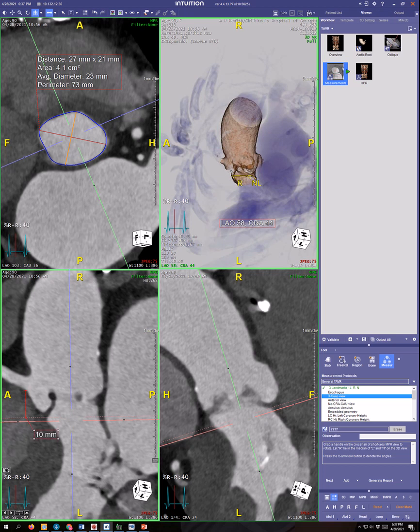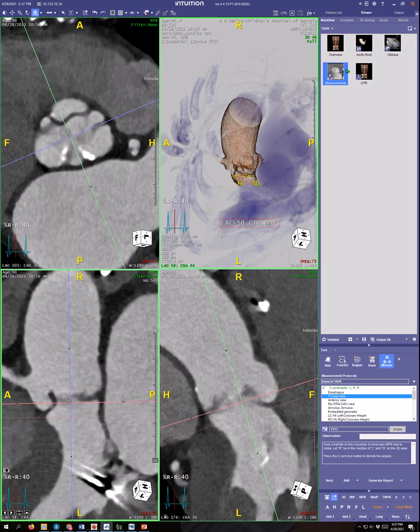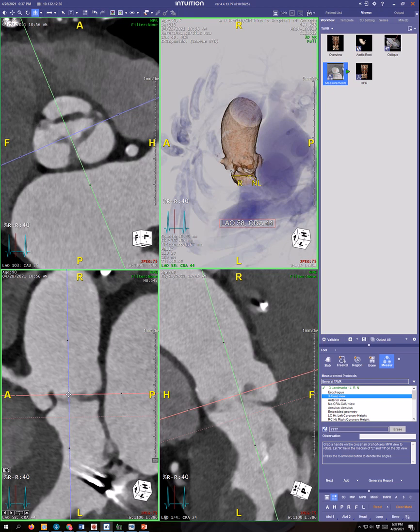It's a little unusual that it's the lower one, but whatever. Now I'm going to just translate upward till we're just below the commissures in each situation. Well, at the commissure there. Oh, come on. Here, let's delete that. I don't know what the issue is.